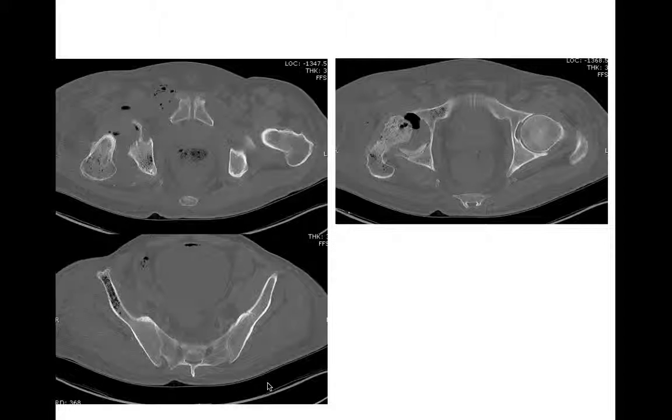Patient went on to have a CT scan, and we can see there's gas within the joint, actually air within the bone, and this turned out to be a very aggressive osteomyelitis, which has destroyed the femur. Here's part of the fractured femoral head, which just kind of sloughed off into the joint space here, and obviously air within the joint. So in this case, this was a very advanced osteomyelitis. Remember, osteomyelitis can look like a whole range of things, from a geographic 1A lesion, from a simple Brodie's abscess, to a very nasty permeative lesion of infiltrating osteomyelitis.